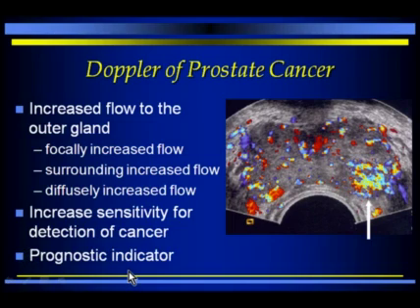Prognostically, if you have a cancer and it has Doppler flow, the presence of increased Doppler flow within a cancer is a poor prognostic sign for that cancer.